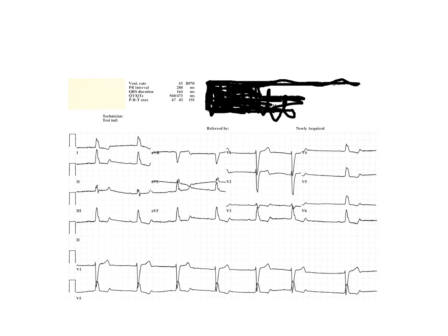present here. It's a left dominant axis in both 2D and 3D. There is the RSR prime or a squiggle on top of the QRS. There is QRS to ST discordance, and there are asymmetrical QRSs in the precordial leads.